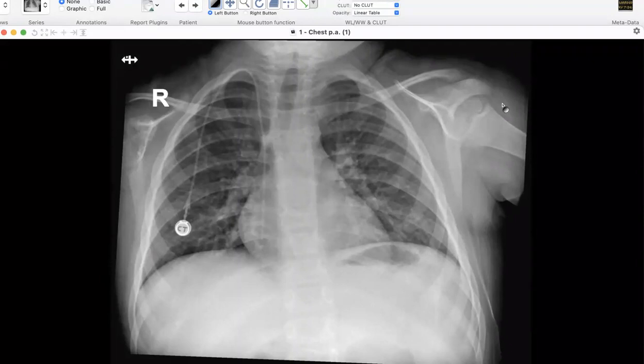So this is a routine screening image. If you say it's normal, they're not going to do anything for it. If you say there's something abnormal in the X-ray, maybe you can suggest that they do something else. You're right. So I'm suspecting that there is maybe some osseous dorsal spine abnormality here. So really we need to assess this one. If not by CT, it will be by MRI of the dorsal spine.